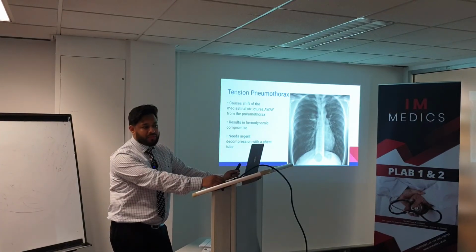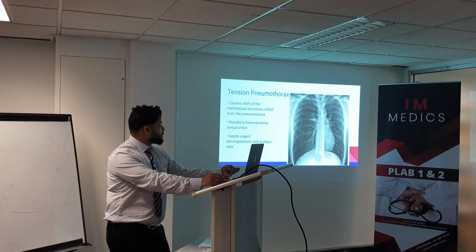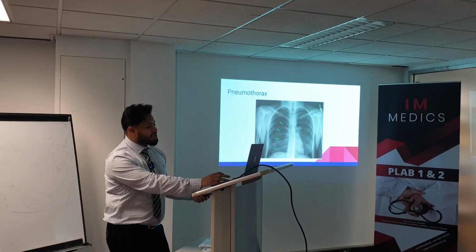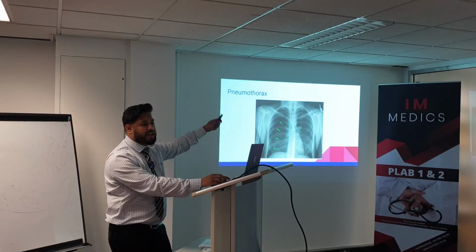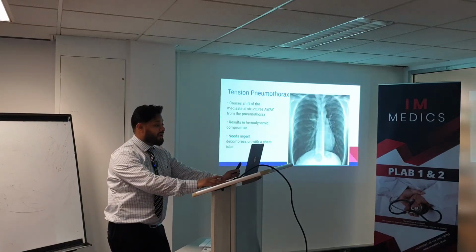But cardiac tamponade is a triad. This is a triad, the three of them. If one of them is missing, then it's tension. So this is tension because it's pushing it. This one is no tension because it's a straight line, but you can see the line in a proper picture. The other side will be pitch black. Remember, black means air. And then that's it.